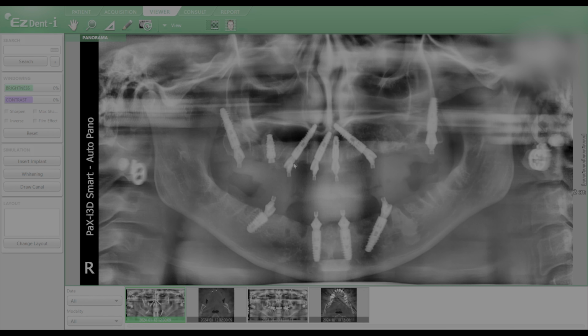Right. So we mentioned in this video zygomas and pterygoids. I did implement the pterygoid strategy though, right? Because I wanted back support. So let's look at what her x-rays looked like after the surgery. Here's what we did. We got these 4 implants, we got great stability, trans-sinus on those. We did pterygoids, and we also did, again, sinus lifts on both sides.